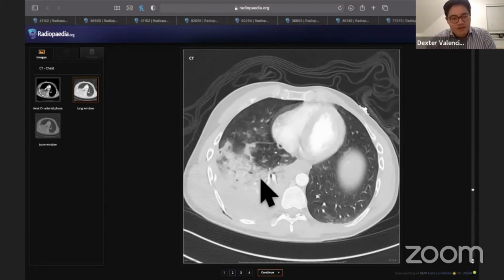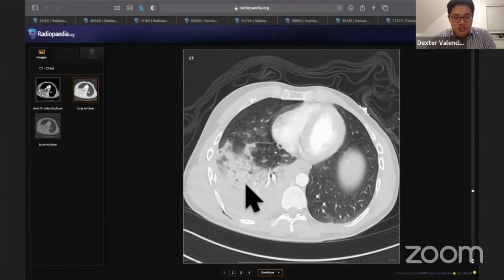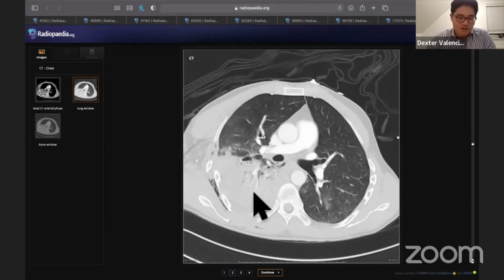Normally, if you saw an area of enhancement, it would look like a lesion. It would look like a rounded shape or an abnormal oval shape, which when you scroll through it is basically looking like a ball within an abnormal area. It probably would push some of the vessels away, and that would tell you that there's probably a mass somewhere there. But it can be very difficult, and that's why we often say repeat the scan, because there could be small cancers hidden in consolidation, but a lot of the time it's really difficult to identify that.